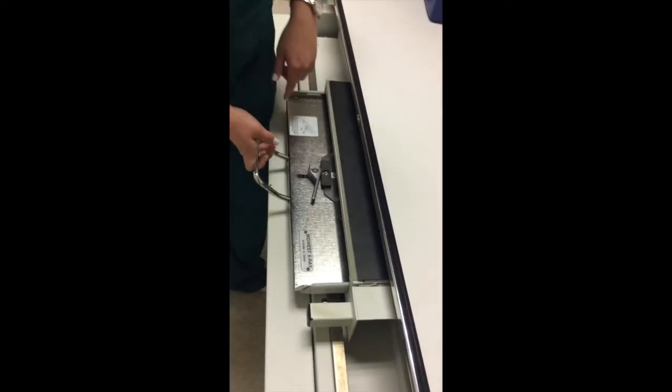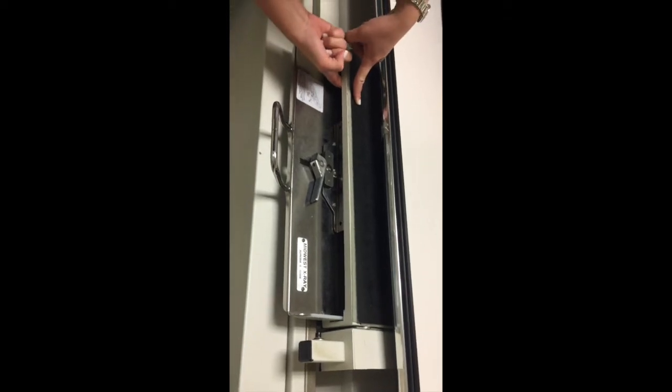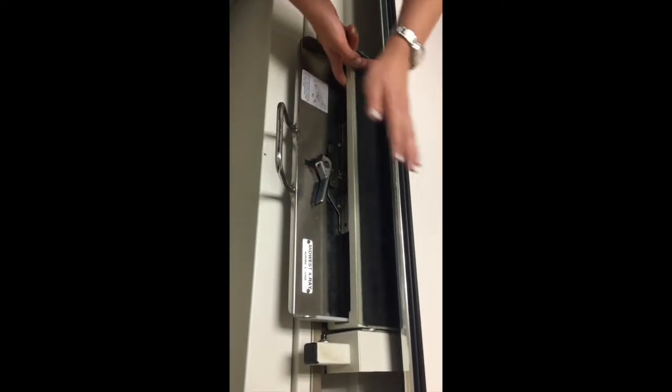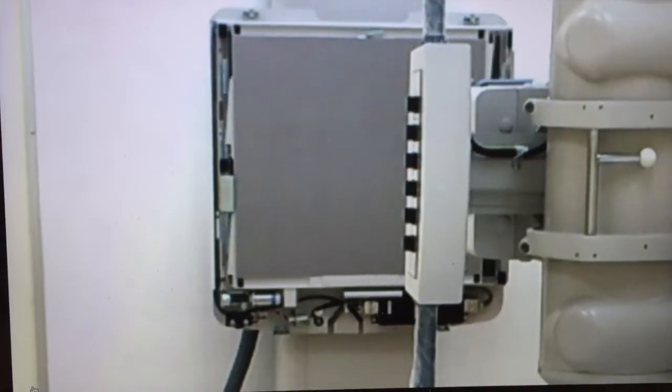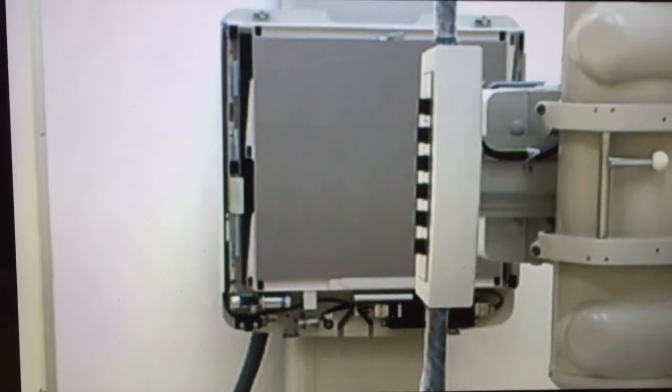This is the table Bucky, and right here we'll put the IR, but this part right here is actually part of the grid. The grid will go in the middle right here under it, and the grid is going to go in between the table and the actual IR. A grid can move in either of two ways during an exposure. One way is oscillating, which is in a circular motion, or in a reciprocating way, which is back and forth. This is an example of the grid moving in a reciprocating way.